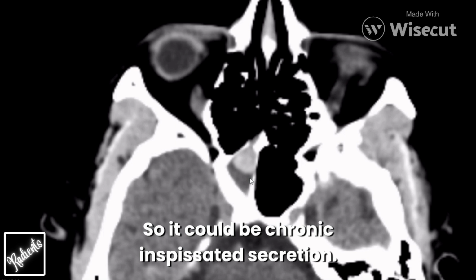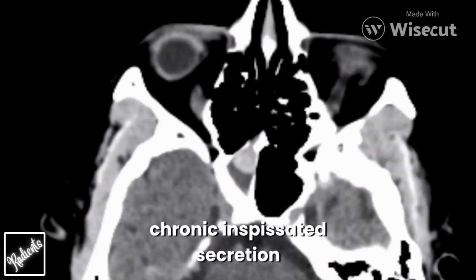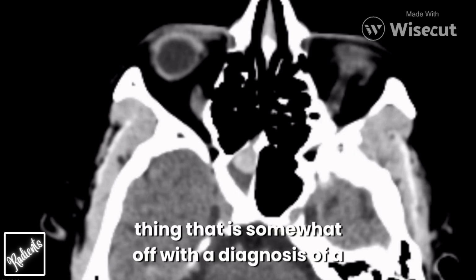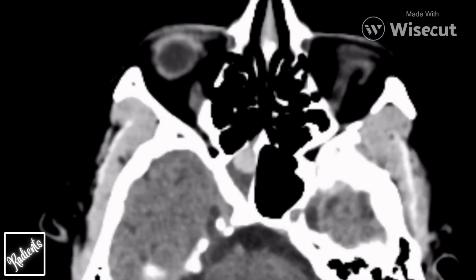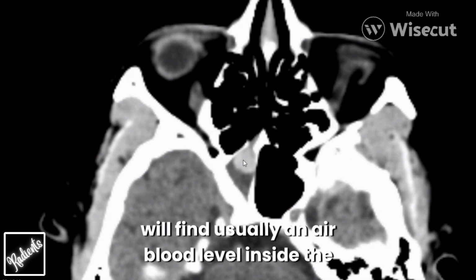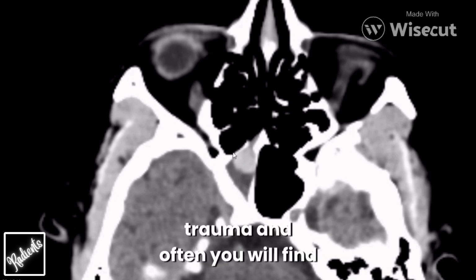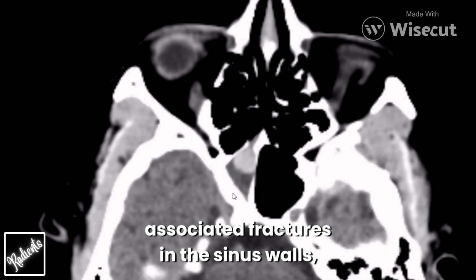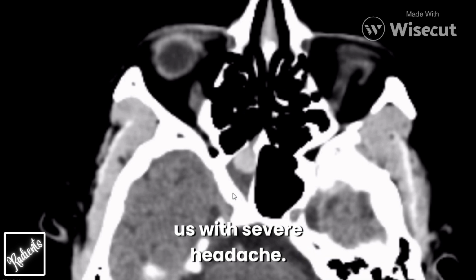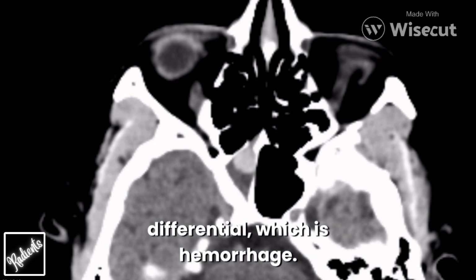So it could be chronic inspissated secretion, but the issue here is that you usually do not find chronic inspissated secretion to take such a well-defined rounded ball-like shape. So that is one thing that is somewhat off with this diagnosis. Secondly, if we talk about hemorrhage, usually you will find an air blood level inside the sinus. You will get a history of trauma, and often you will find associated fractures in the sinus walls. Whereas this patient, who is a 59-year-old female, actually presented to us with severe headache. So it's nothing related to trauma. That also pretty much rules out our next differential, which is hemorrhage.